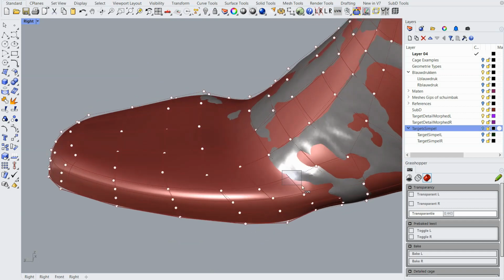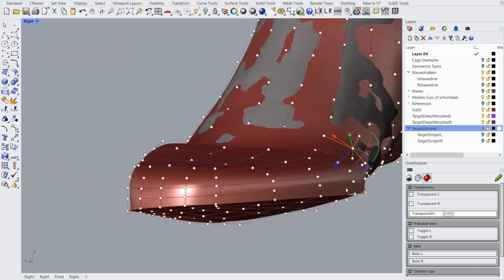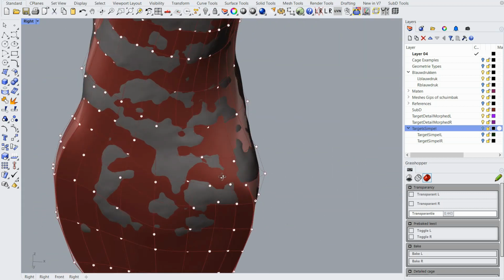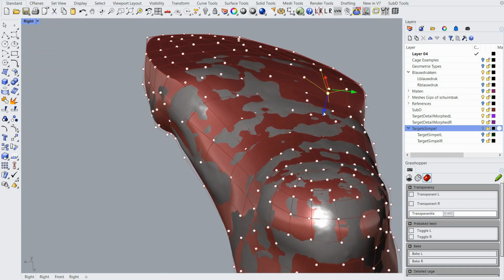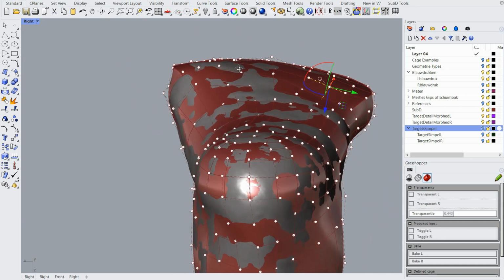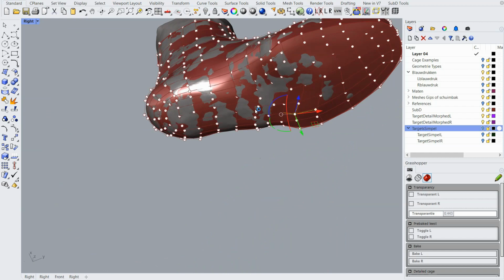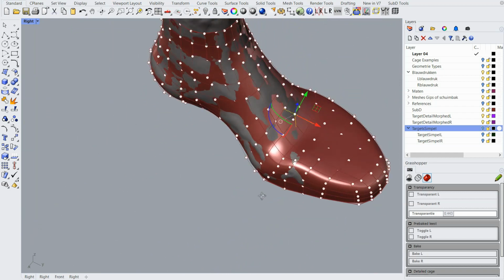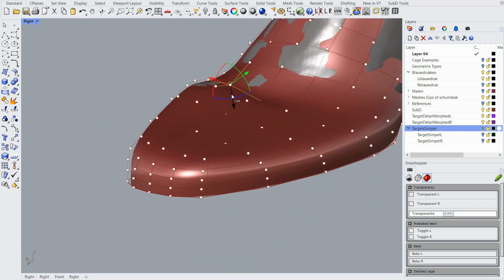Well, you can spend the rest of your life doing this, dragging control points. But it's just a matter of fine-tuning. And other CAD systems I've seen, they don't allow you to work on this level of detail simply because they don't have the control points at the right places. Shall I give extra room here? Okay.